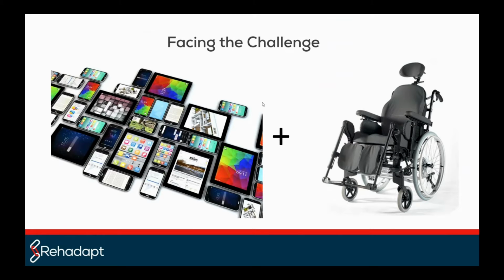Some people using bigger tablets, some of them using smaller tablets in a mini size, some of them using tablets with different kind of protective covers. And we all have the challenge, especially with someone that is unable to hold it and to control it safely enough, to position it to the environment and to the place where your customer is. Often we see people with cerebral palsy located in wheelchairs. So now it's the question how we can attach these systems safe, stable, but also without limiting our customers in their environment on the places where they are.